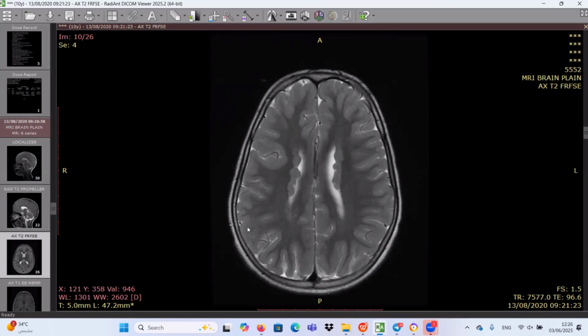Further MRI assessment was performed, and I think it's straightforward now. We have a heterotopia case. Do you know which type of this one? Which type of heterotopia do you have? So there are three types. It's focal, and it's under the ependymal lining, and it's band heterotopia. I think this is the second one.